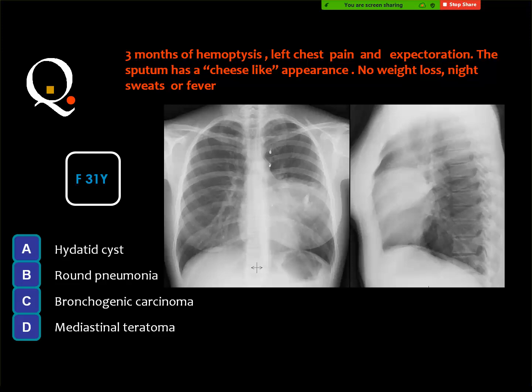especially in major events. A patient has a bronchogenic carcinoma, then you mention atelectatic bands as well. And a patient with COVID-19, then you mention some atelectasis and so on. But usually you avoid it, because the clinician may interpret this wrongly and let the patient do further investigations which are useless. Then it is better to avoid this atelectatic band except in the exam, because the examiner usually wants you to see everything in the film.